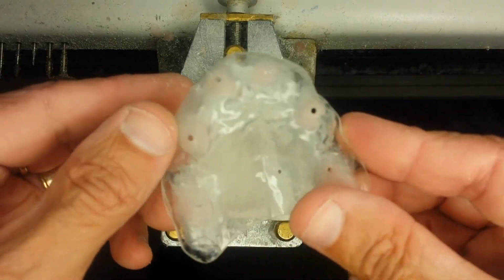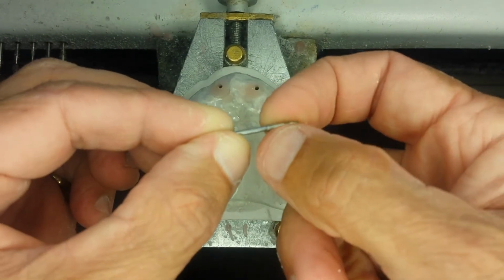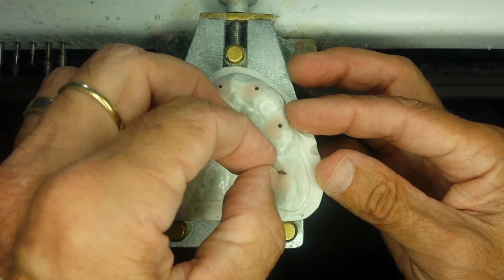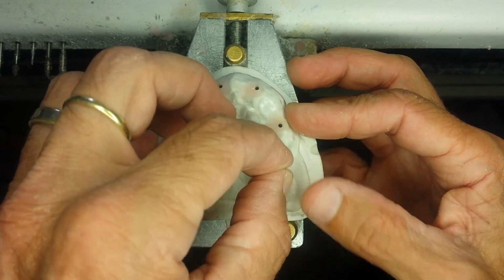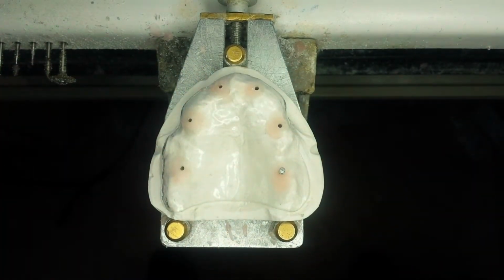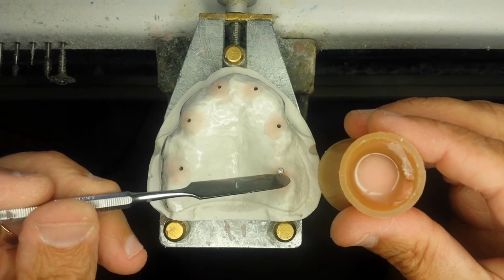Using the surgical guide. The SIG is detached from the thermically formed mould. A guiding rod, the same diameter as the pilot drill, 2 mm, is slipped into a hollow cylinder of 2.1 mm internal diameter, which then acts as a drilling barrel. The whole thing then penetrates through the mould in one of the bore holes on the plaster model.